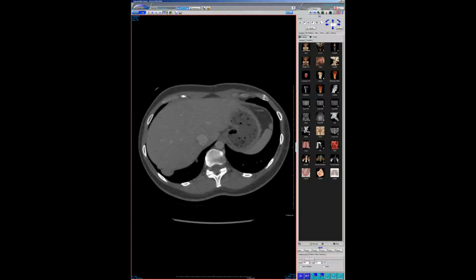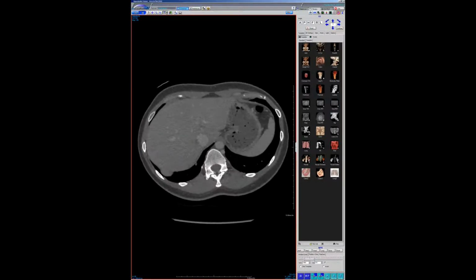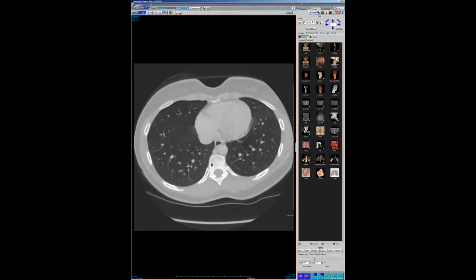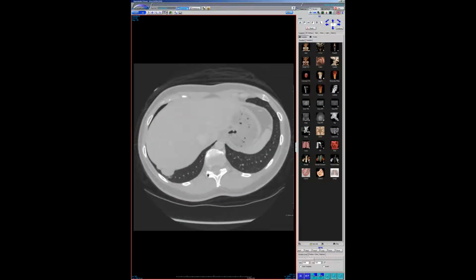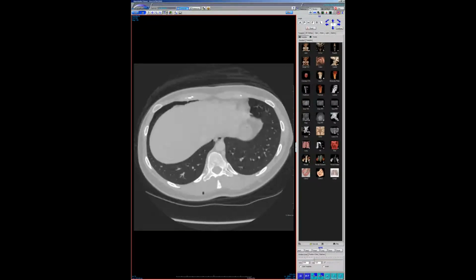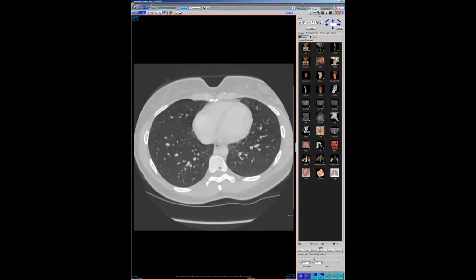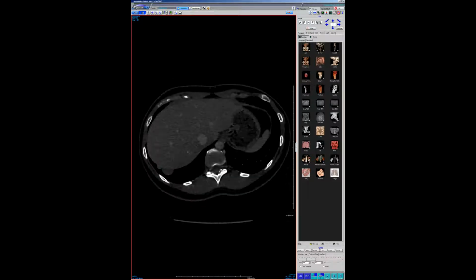Looking at her history, which was actually a surprisingly good history, a note said that she had severe chest pain with the onset of menses. And further on in her other notes, they described that she had stage 4 endometriosis with peritoneal implants, which I don't see here, as well as infertility and other issues due to endometriosis. So this is a catamenial pneumothorax with endometrial implants, or at least presumed.